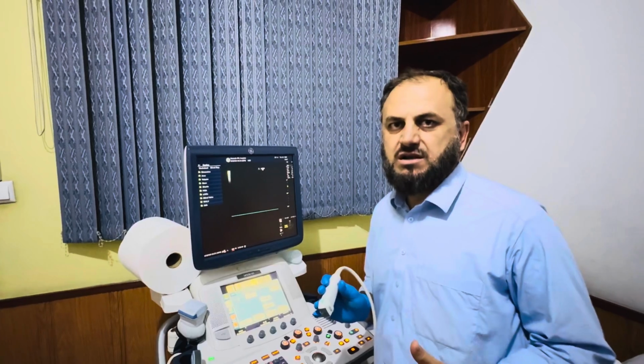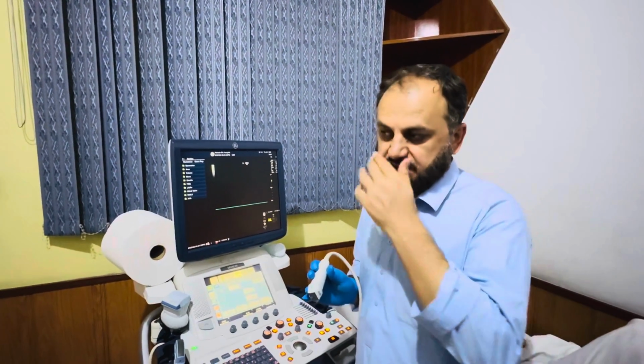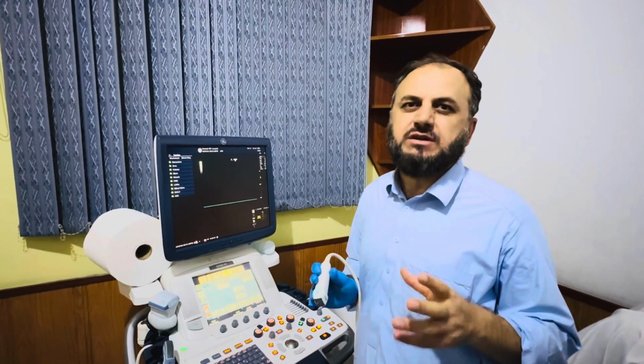Quickly, fast, if a patient comes with chest pain or anything, you will be able to find if there are any considerations. It can be anything related to pleural effusion, pericardial effusion. It can be valvular disease. It can be myocardial, any kind of diseases, or we can say ischemias or coronary heart disease or whatever. So it will be easy to find it. These are the 5 windows.